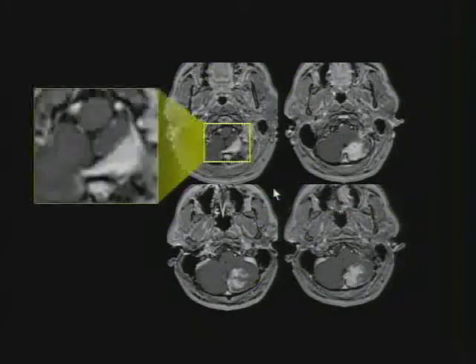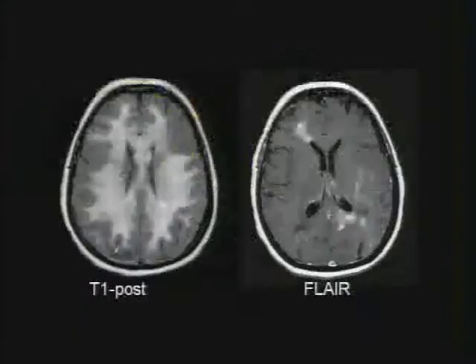This was called glioblastoma, but I'm going to show you. Whenever you see a parenchymal mass in association with a dural component, glioblastomas almost never present initially as a dural-based mass. So whenever you see this combination of parenchymal and dural involvement, think about metastases, think about lymphoma, and this is a lymphoma. Another example of multiple enhancing masses of the brain.